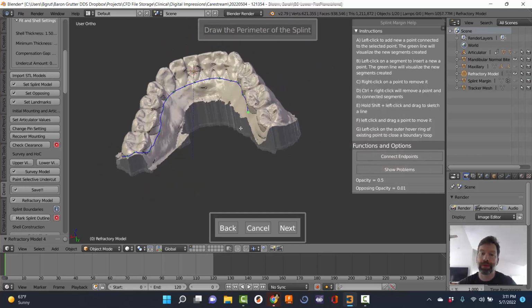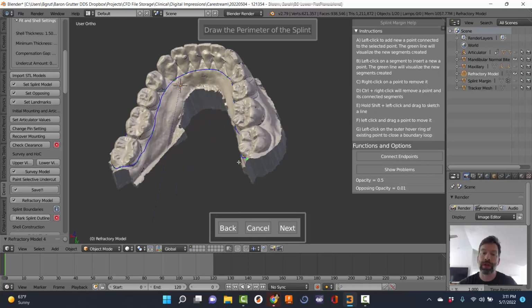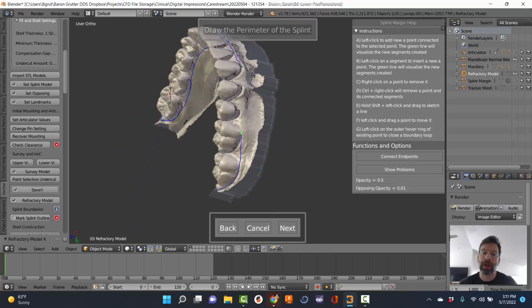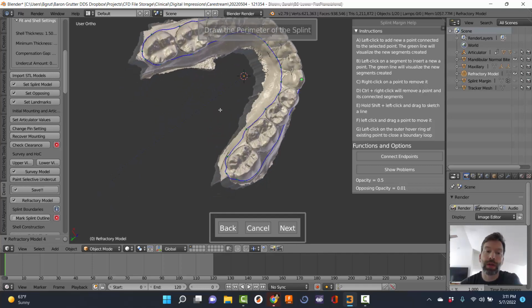So yeah, I suppose you could remove it from the lingual aspect, bring it up there so it was more just setting up over the incisal edge and the facial. That would be fine. I don't really feel there's any point in it, and if I ever really wanted to, I could take a burr and relieve it. So I just was marking each point, and you can mark them however you want. When you're all done, when you're ready to finish, as you drag and get closer, you'll see that this little green line wants to connect the two of them. So I click right there, and now it's one solid line.